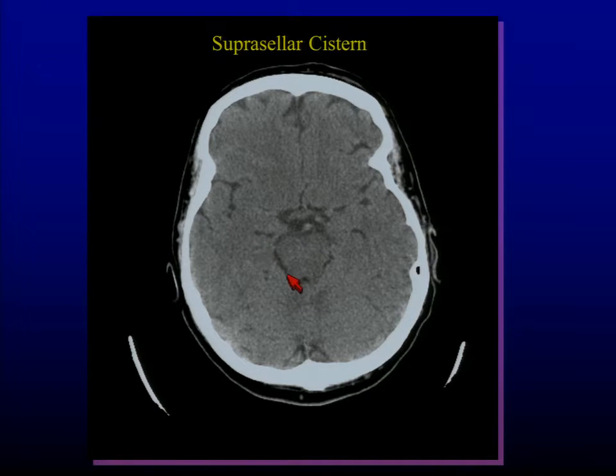I'm still catching some of my circummesencephalic cistern, and again, that depends a little bit on how that patient was tipped in the scanner. That's a radiology technologist judgment of how they angle the scanner versus how the patient's head is in the scanner. So you can see both on the same. Sometimes you'll see one and then the other. But I know my middle cerebral is reaching out here, my middle cerebral is reaching out here, anterior circulation comes up here, my posterior circulation comes around here. My circle of Willis lives here, so if somebody comes in and I'm worried they have a subarachnoid hemorrhage, this is where I'm paying a lot of attention, to the circle of Willis.